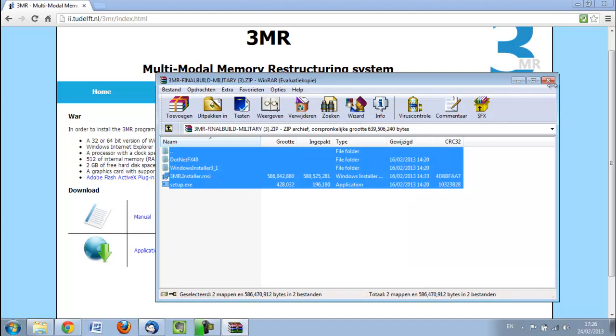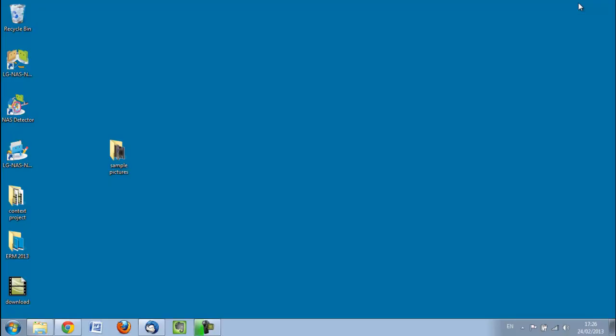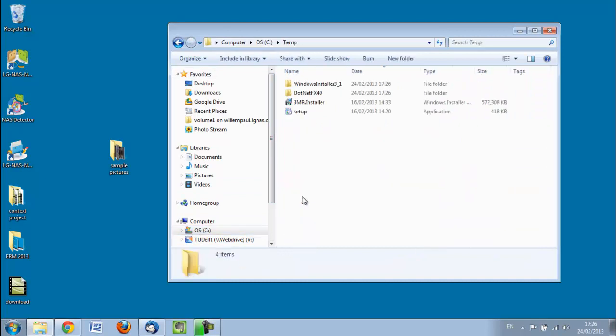Okay, that's done. Close this. Close this. Then go to the directory. And I press setup.